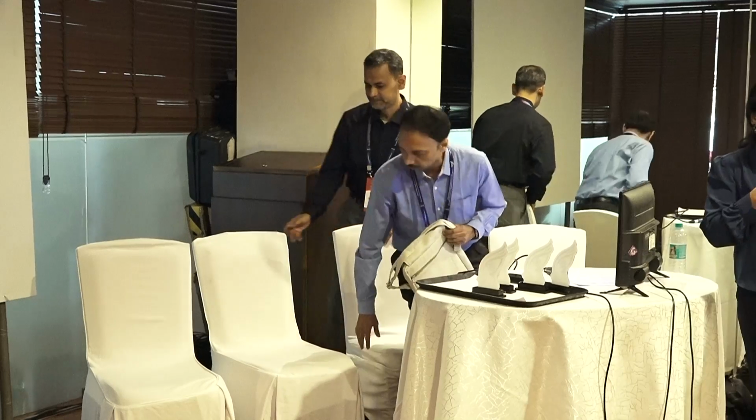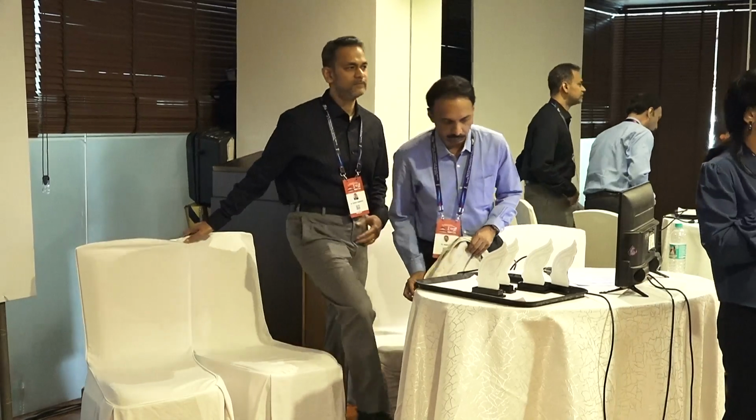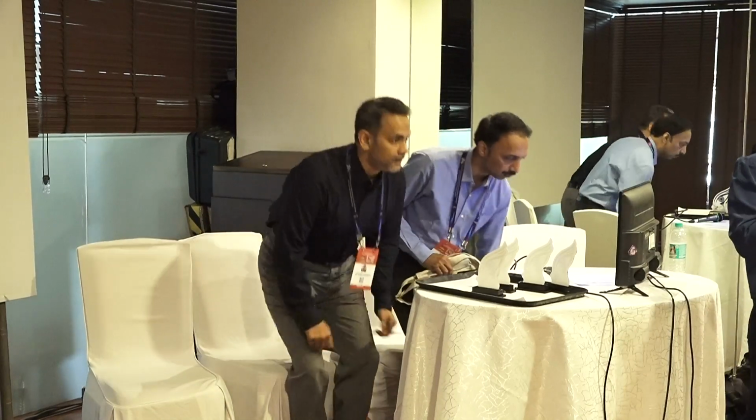Good morning, everybody. It's a pleasure to welcome you all to this instruction course on OCT and OCTA. Over the last decade, OCT has moved from being a diagnostic tool to becoming a decision-making platform. Today, biomarkers extracted from these OCT and OCTAs help us not only to diagnose but also risk stratify and predict the treatment response. I now request Dr. George to start his keynote address.